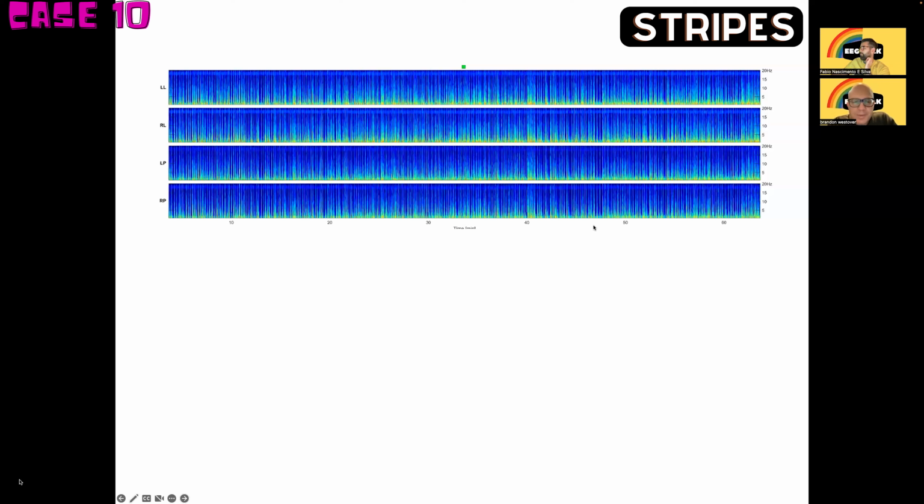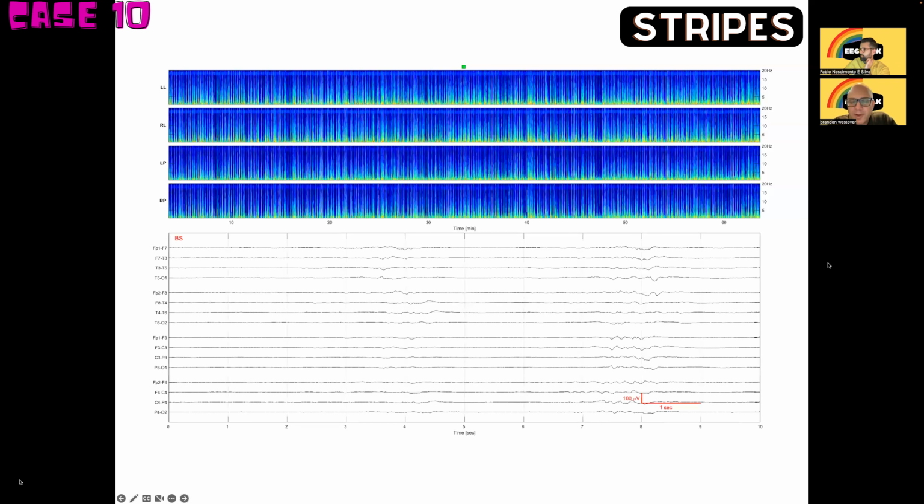Okay. Let's take a look. I could be wrong. It's a lot of blue, so I'm wrong. Or maybe you just got the blue part mostly. I'm pretty sure I'm wrong. You're right. Yeah, but it's burst suppression. Okay, got it. Nice.